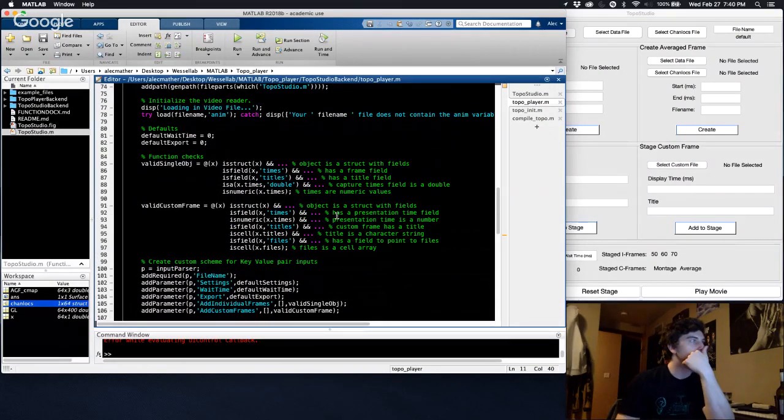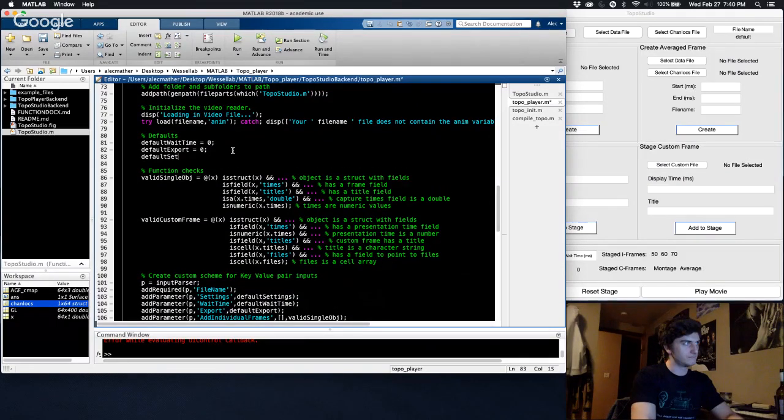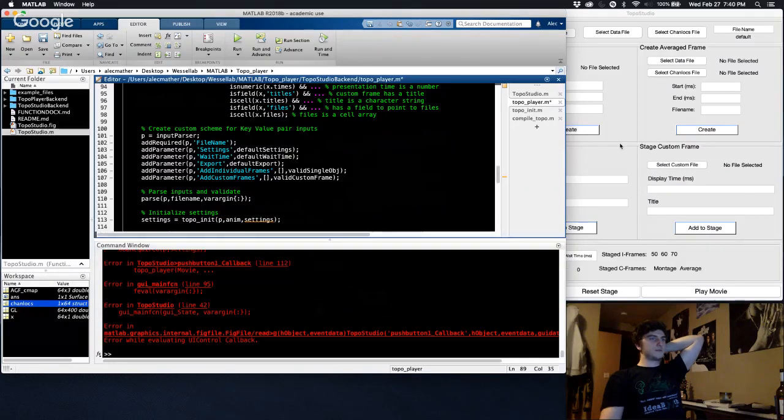And then we'll make our default settings. I guess like nothing. Well, it doesn't really matter. Like you have to add your settings in because you need a sample rate. Let's see what happens.